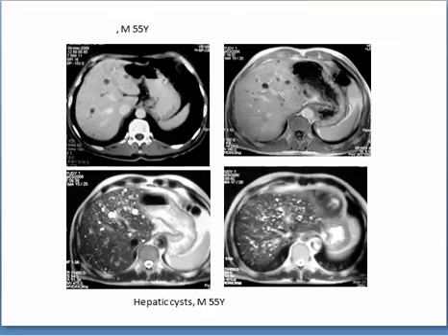Here we have this widespread small hepatic cyst, simple hepatic cyst with no enhancement, and of course hamartomas is a possibility, biliary hamartomas.